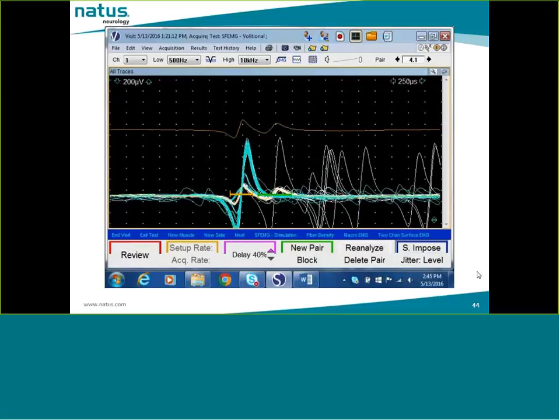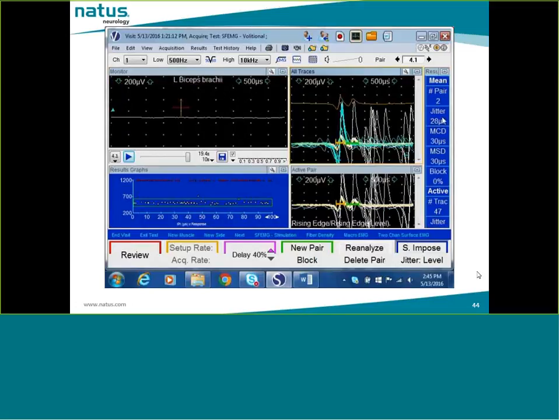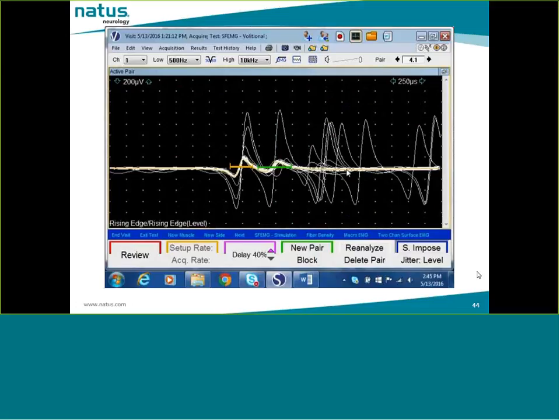And the reason is that the jitter is normal, 28 microseconds. We cannot have blocking when the jitter is normal. So this is a powerful rule to exclude mistriggers or the technical blockings. Let us look at the traces that were accepted for analysis by the program.